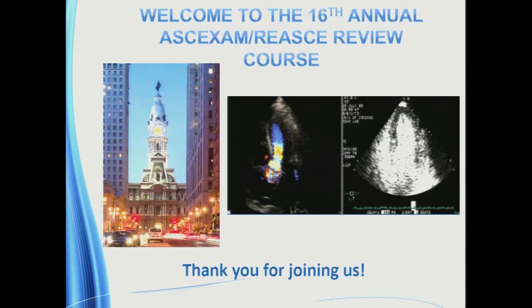What criteria do you use to identify an aortic root abscess? It would be as a mass. Yeah, so it would be an extra space outside of the aortic tissue in the contour. It may be homogeneous in nature. It also may have a cavity within it. And just remember, it's very frequently present in patients who have aortic valve endocarditis. About 10% of patients, I would say, is very frequent. And it's much more common if you have a prosthetic valve.